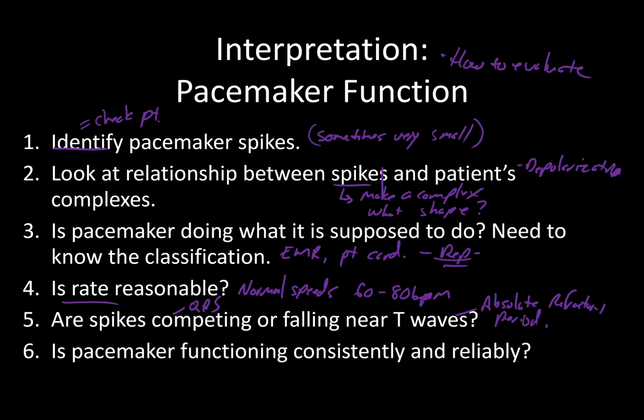The last thing you want to ask is probably something that pops first in your head, which is, is the pacemaker functioning consistently and reliably? Is it not doing anything at all? Or is it sometimes working and sometimes not? Those kinds of things will come out. But by the time you get to step 6, you should already have that answer. Other things you could maybe encounter are problems like a runaway pacemaker, or if it's got a defibrillator, it's shocking. But those are other things that we'll go through as we move forward.